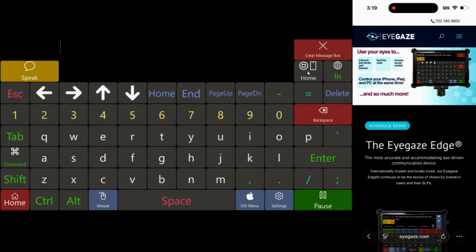In this video, we will be demonstrating with an iPhone 14 Pro Max running iOS 26. Please note, your hotkeys may vary if you're using a different device or version of iOS. Keep in mind that for any hotkey that has a corresponding keyboard shortcut, you can enter that shortcut into the keyboard to accomplish the same action as selecting the hotkey.